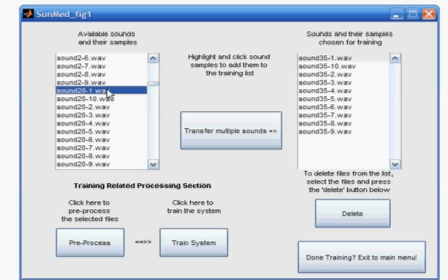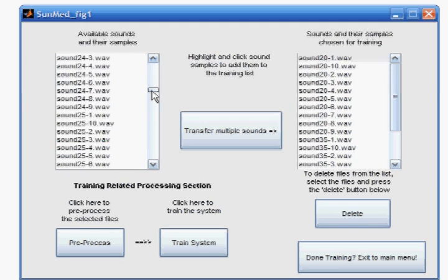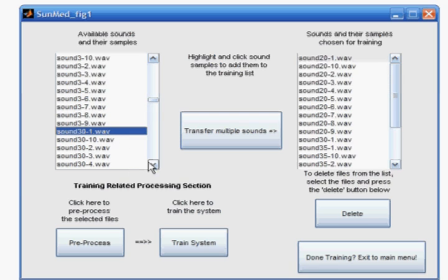While this particular test is for pneumonia, the algorithms used in the system allow it to correctly diagnose a vast number of different respiratory diseases, from asthma to cystic fibrosis and beyond. This allows the system to have great longevity and also be used in many different medical cases.